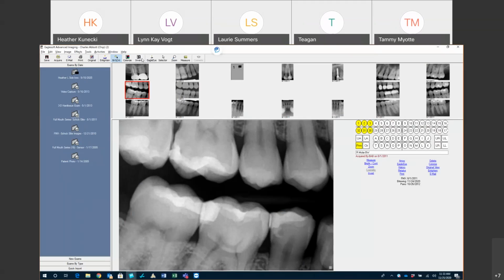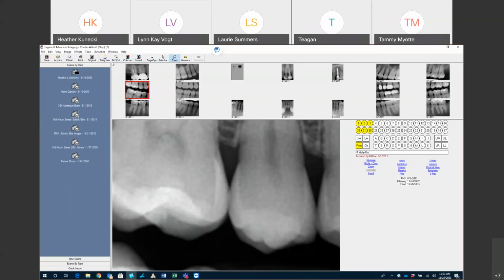And then if you're on this one, I also like to point out the eagle eye. The eagle eye means you can kind of zoom in on the image for you. So if you're trying to look interproximal and you're trying to see, again, these are fake pictures, they're simulated, so it's not going to show me that good of an eagle eye thing here. But with some of the sensors, you can really see great between those contacts with this eagle eye. You can zoom, so if there's a certain area that you really want to zoom in on and then use the eagle eye, you can really get in there and see between those contacts to see if there's anything that you want. Again, I just hit the zoom feature.